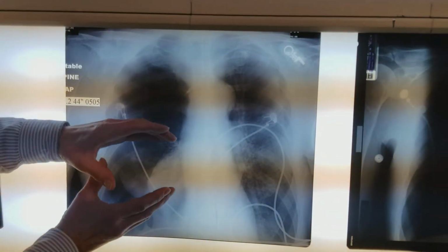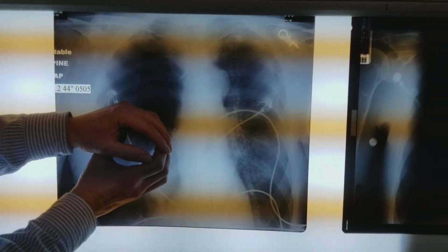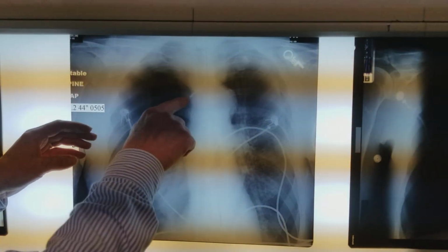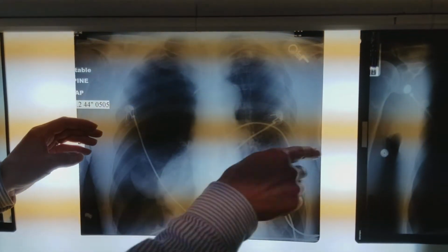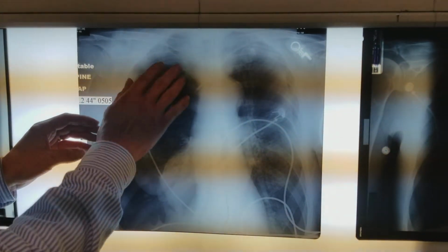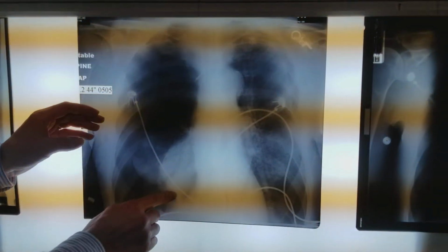And that's what the lung has done. There's air that has collapsed this lung into a little ball here. So this is a pneumothorax, and guess what caused this? See this guy here? Central line. And in a patient who has COPD with a central line, this can happen. So again, here's what's left of the lung in a pneumothorax.